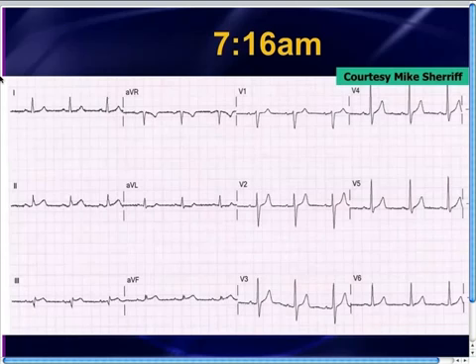Now, when you look over in the inferior leads also, whenever you look at AVL, always take another look also at the inferior leads. You might notice that there's just a tad bit, and I'm seriously saying tad bit, of ST segment elevation in those inferior leads. Probably not even a 0.5 millimeter of ST segment elevation. So who in the world is going to pay attention to a 0.5 millimeter of ST segment elevation? Your EKG machine is not going to pay attention to 0.5 millimeter.